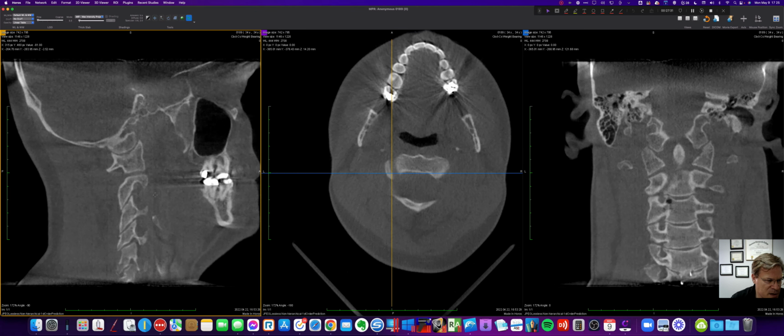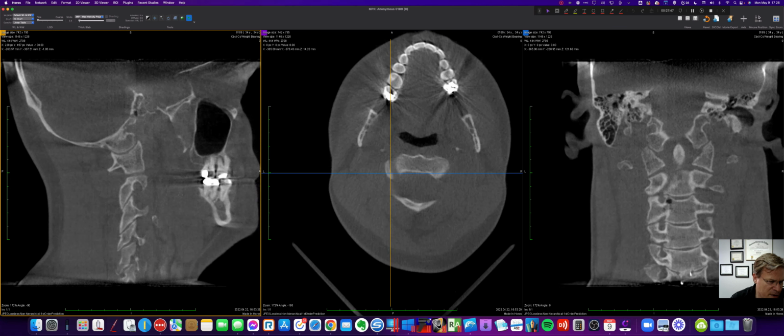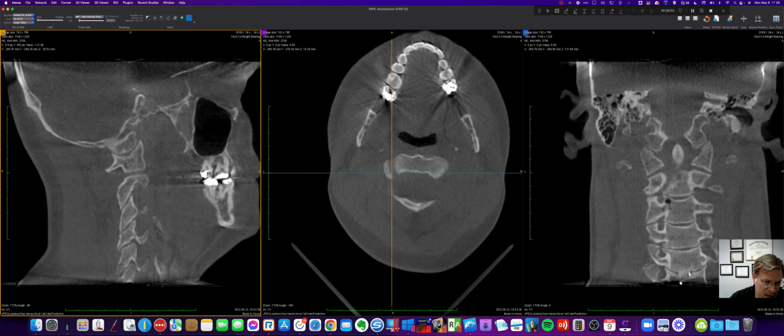Up here, we're seeing an anterior wedge in the joint, but the joints do look lined up. Maybe a little bit anterior, but we would expect a posterior wedge. Again, that's a secondary thing. You can have an anterior without having a posterior wedge, or even indeed have an anterior wedge and a posterior. This one down here looks really obvious. So look, this point is back here, this point is here, posterior margin is way posterior. I'm going to call that definitely a PRI, a C2, 3, C4 PRI on C5.